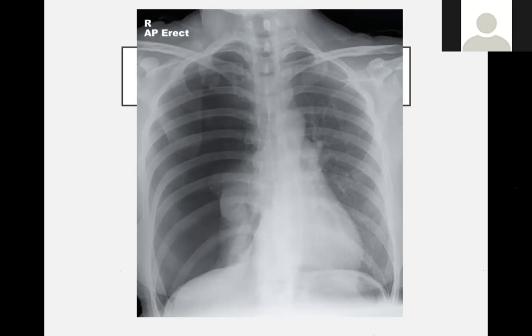We have a comment. Can you clarify the tracheal deviation? I don't think you can see my mouse, but Khalid, if you can point to it. So it's mild. That's the trachea. You can see it in here, starting from here and going slowly to this. So like you said, it is mild indeed. A bit here actually. You won't see it at the bottom, but if you look more superiorly, you can see that it comes down and then there's this shift to the left. So it's very mild. It's not one of those severe cases.